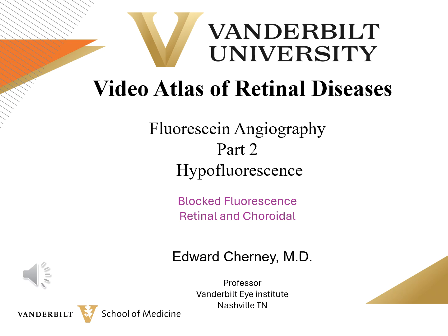As you know from the introductory lessons of interpreting fluorescein angiograms, hypofluorescence can be caused either by something blocking your view of the dye, or the dye is just not there secondary to retinal or choroidal non-filling. In this lesson, we will cover the main reasons for hypofluorescence of the retina and choroid secondary to blockage.